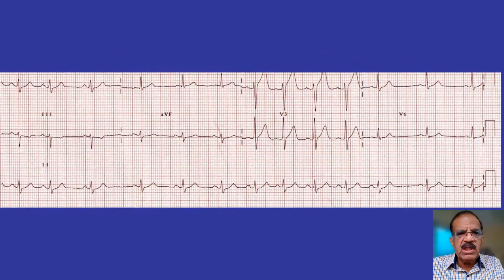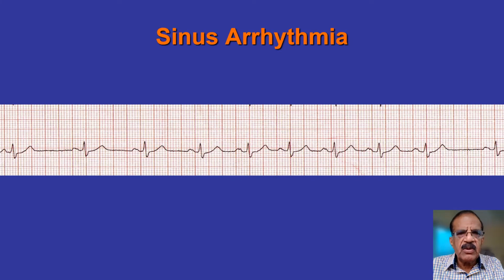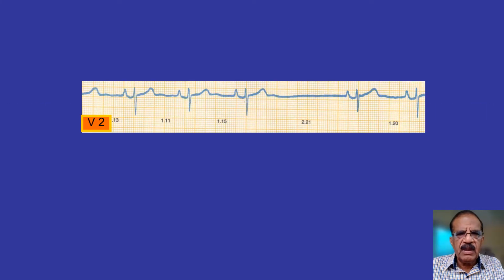So this is actually highlighted by magnifying it. Sinus arrhythmia.